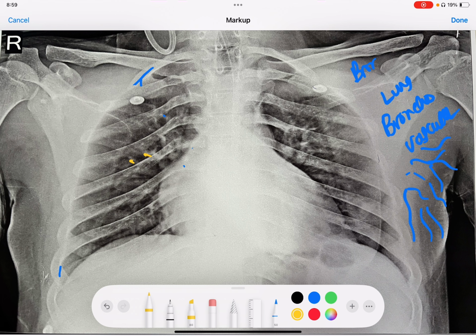So these white lines which are almost spread up to here, this all is lung. So in fact here the lung is spread up to the costophrenic angle. So this is all lung.